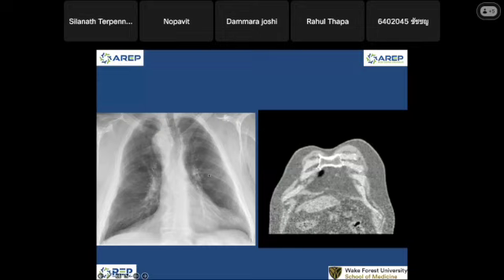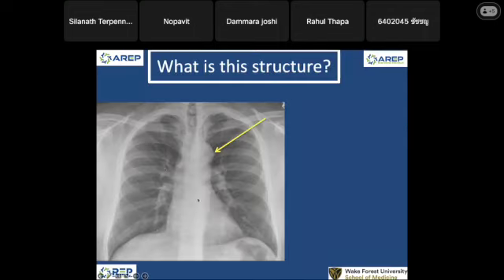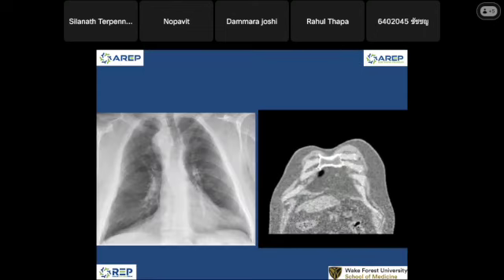Anything else? The trachea is shifting a little bit. Does the mediastinum look okay to you? Okay, let's go back to the normal case. This is my near normal. Forget about this aortic nipple here. This is my near normal. This person is younger, and memorize this chest radiograph. I'm gonna go to this case. Okay.